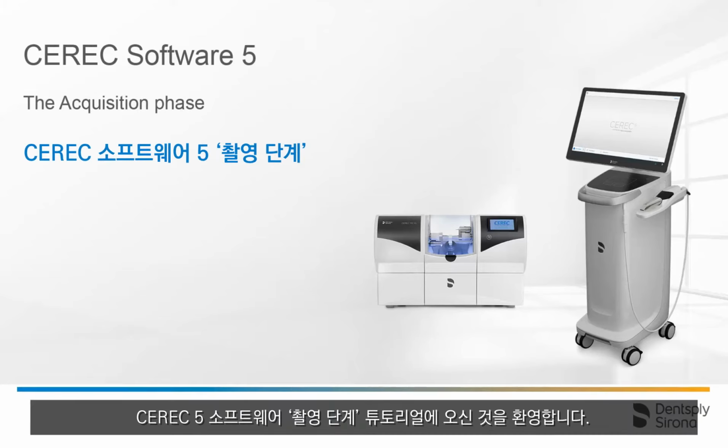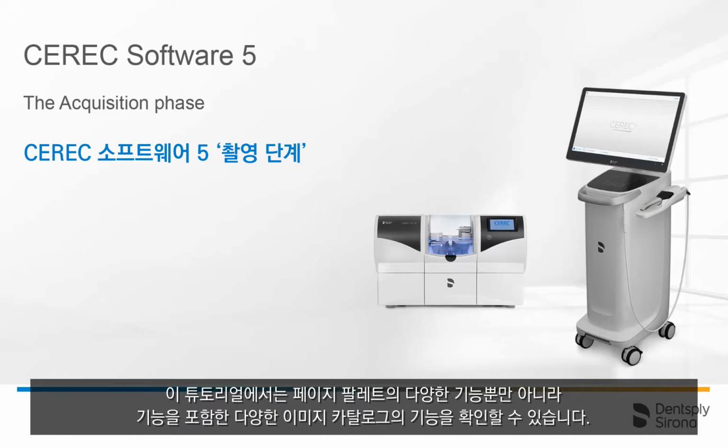Welcome to this video tutorial on the topic of the acquisition phase with the Cerec Software 5. In this tutorial, you will get to know the different image catalogs, including their functions, as well as the different functions in the page palette.